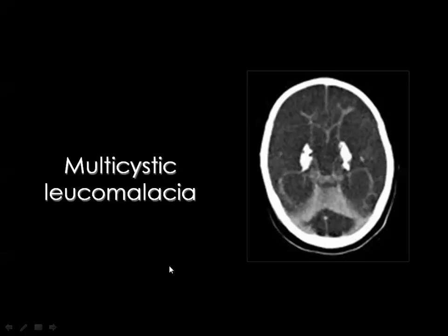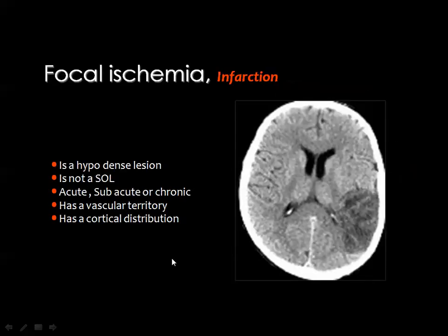The end stage of hypoxic ischemic encephalopathy is the appearance of a totally damaged, destroyed brain parenchyma, which is the seat of multiple cystic areas of encephalomalacia with dilated ventricles to compensate the loss of volume of the ischemic tissue, and there may be foci or areas of calcification within the dead brain tissue.